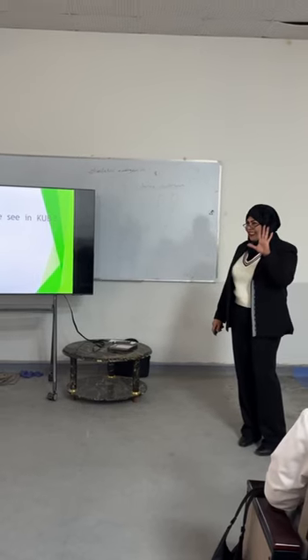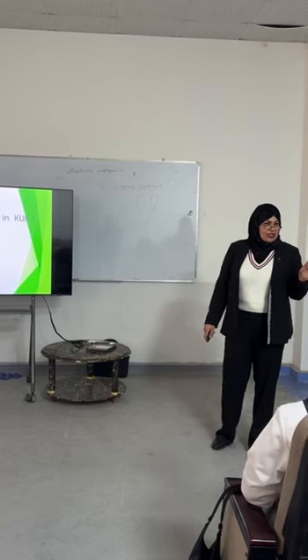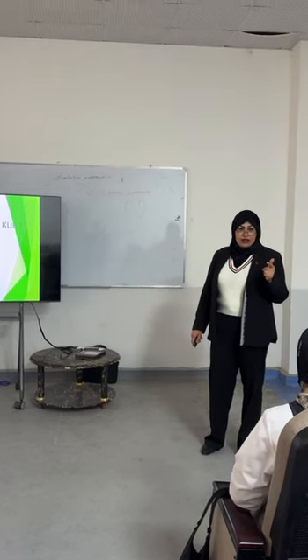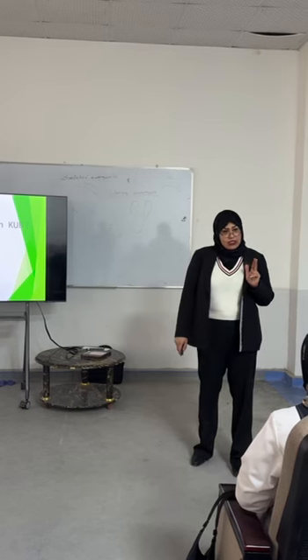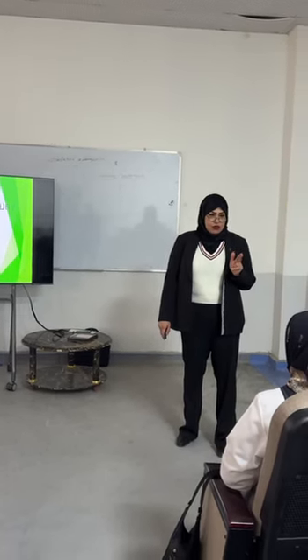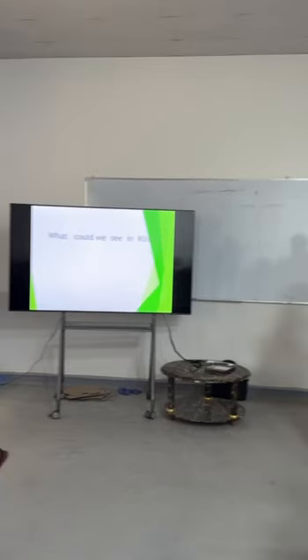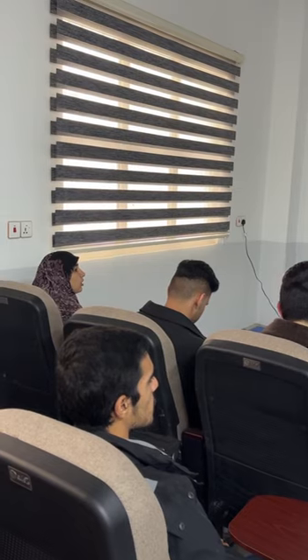First of all, we start with the commonest: stone. No, it is a big mistake. Hydronephrosis is a dilatation in the pelvicalyceal system. Can we see it by KUB? I'll show you later. Another one, TB, as what? TB, not as a lesion.